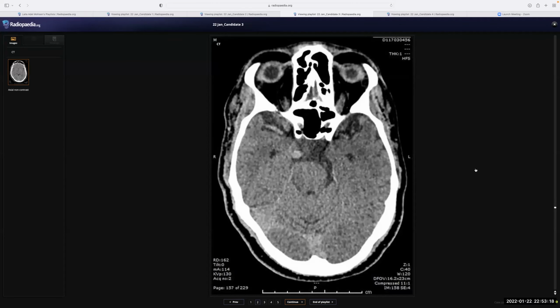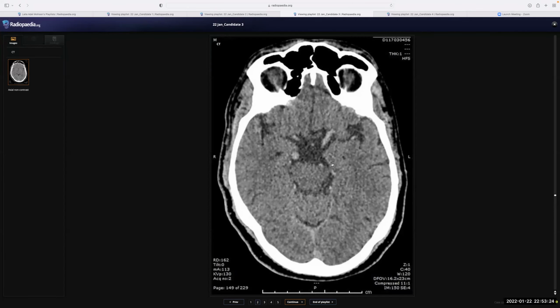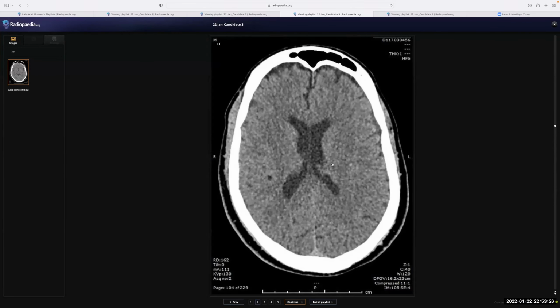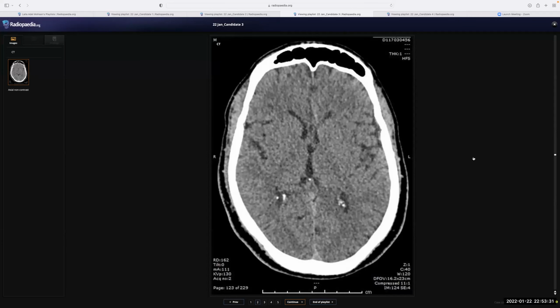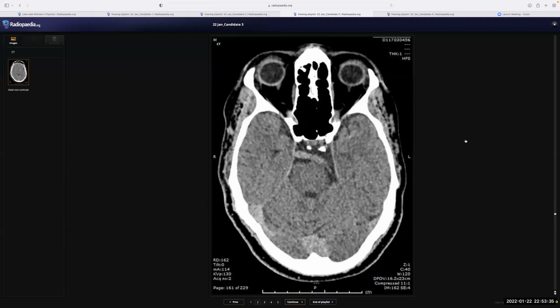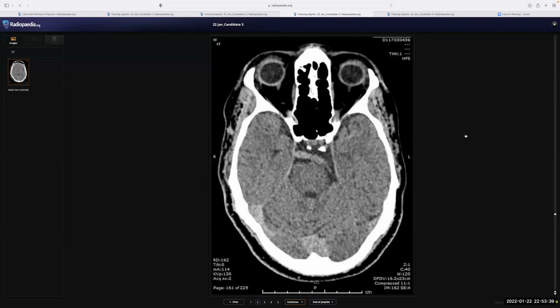You will not do anything else? I mean, are you sure it is a thrombus? It is dense. Well, I can use the stroke window to see the density, or I will change the window if possible to see if it is really dense or not.